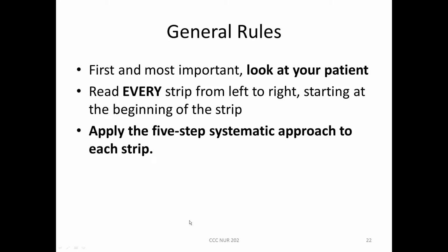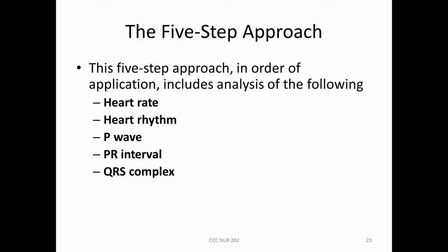But with the general rules, you will be applying a 5-step systematic approach to each strip. The 5-step approach is in order. First, you're going to do heart rate, then heart rhythm, P wave, then PR interval, and then QRS complex.